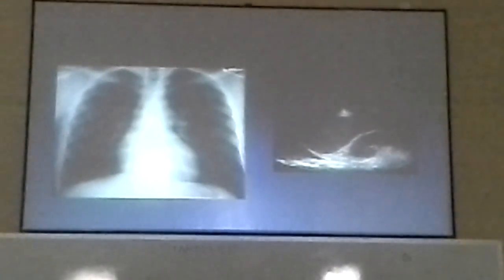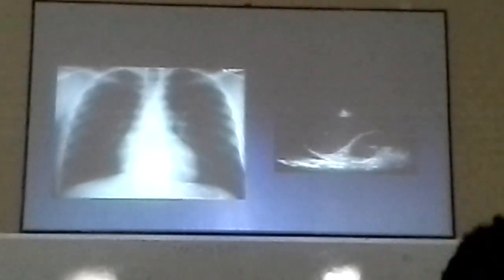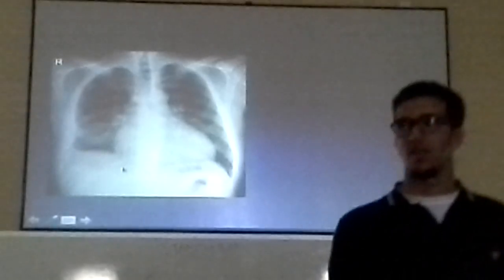Yes? No, there is blunting like this. If you see, this is blunting. If you go back, sorry. Okay, I will show you another clear X-ray. So, this is another patient.